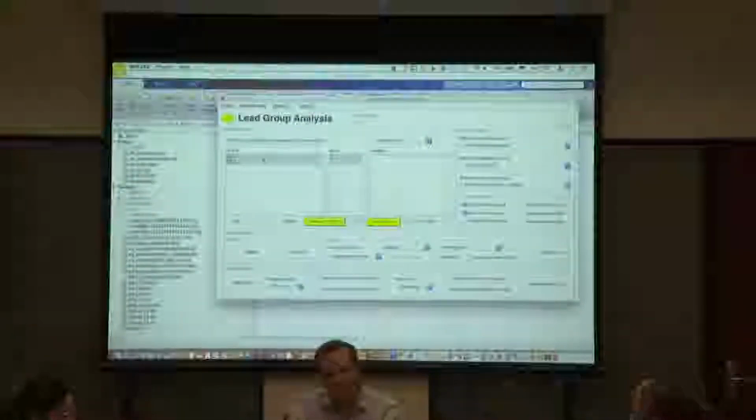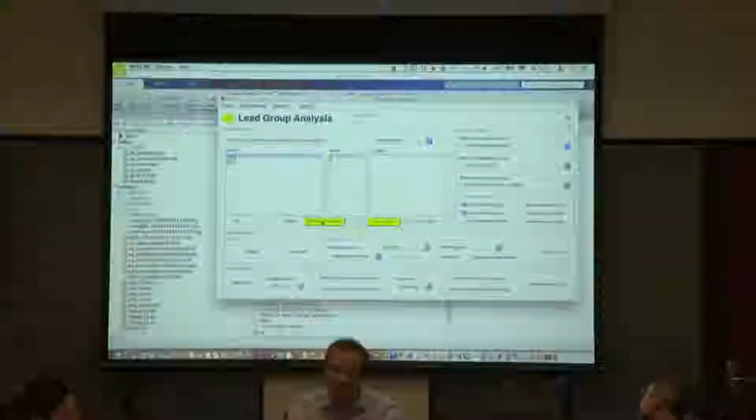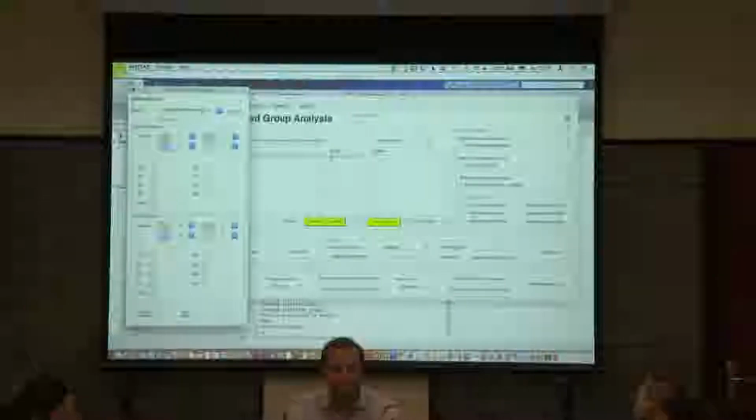But one other thing that is nice is that you can enter the stimulation parameters of these patients directly here in Lead Group, and it will be exactly the same thing that you've seen before, right? So we have these stimulations.